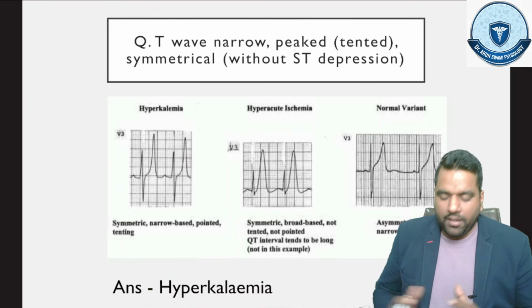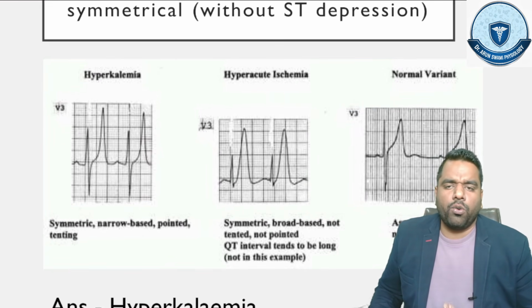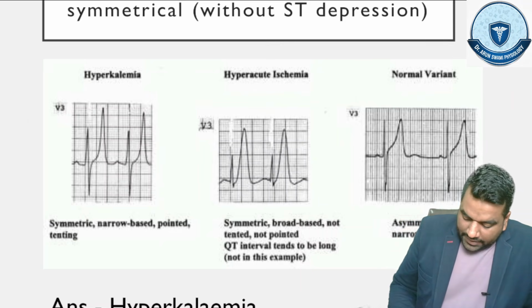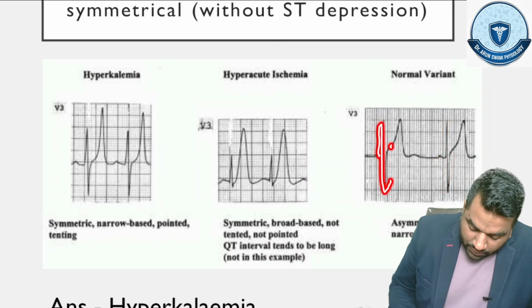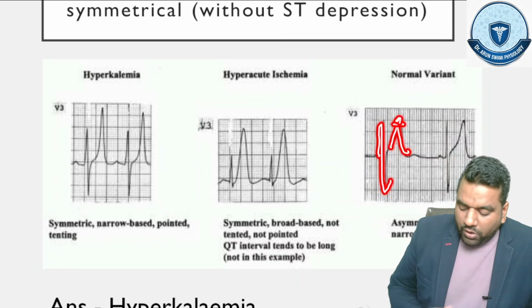Hyperkalemia. Very, very important. Sometimes students get confused about what is normal, what is hyperacute, and how hyperkalemia could be seen. You can see over here the QRS forming like this. Right guys? Can you see this QRS? This is your QRS and this is your T. It is almost up to the level, or a little bit going upside.